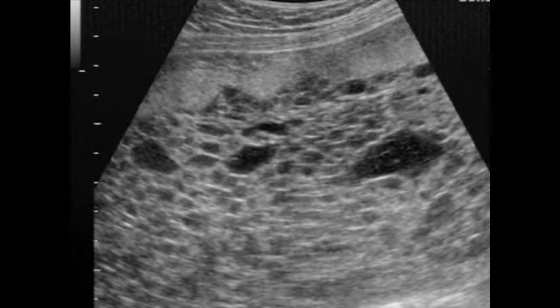Of clinical relevance also is the fact that when these pregnancies need to be evacuated surgically, the risk of bleeding is very high, and therefore one should take precautions to anticipate this, since complete moles bleed very, very heavily. This last image gives us another view of the snowstorm appearance within the uterine cavity.